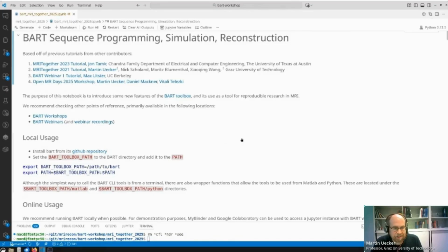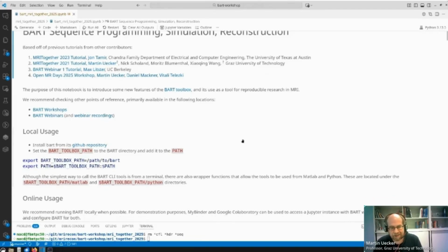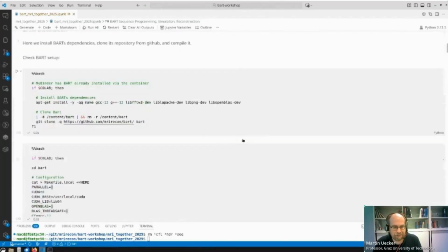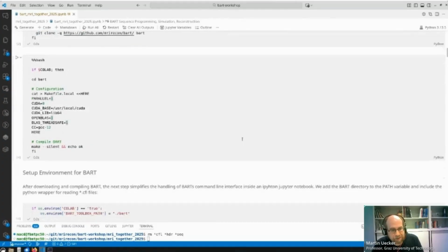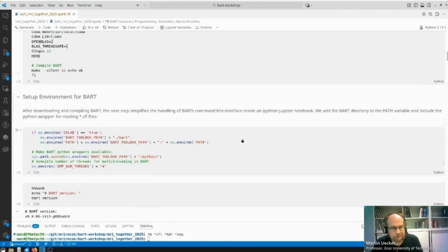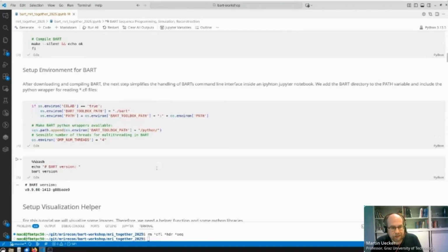In general, BART was meant as a toolbox of many different little tools which can be used and combined in different ways. And I'm also very happy to see that other projects pick it up as a component. So if you have the Google Colab open, I ask you to already start maybe the first 5 cells, because this is a part which may take long.